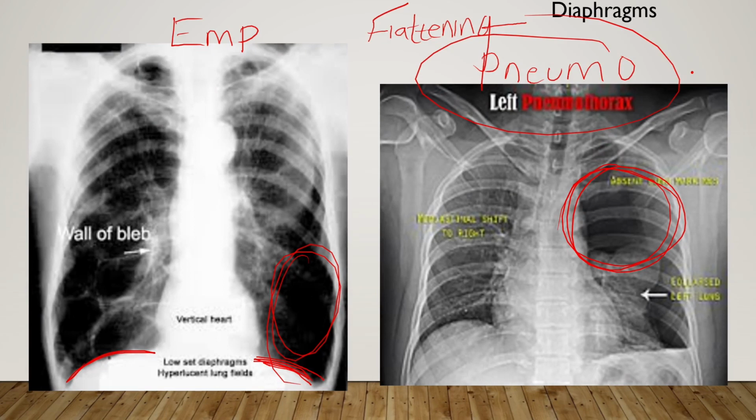So emphysema is a bilateral disease. So with the diaphragm, you can see bilateral flattening, all right? As you can see, what I've shown you in red over here and over here, you can see that the diaphragm is not humped, it's not peaked, it's very flat. This is one of the characteristics of emphysema. But obviously, don't just look at the diaphragm and just make a conclusion.